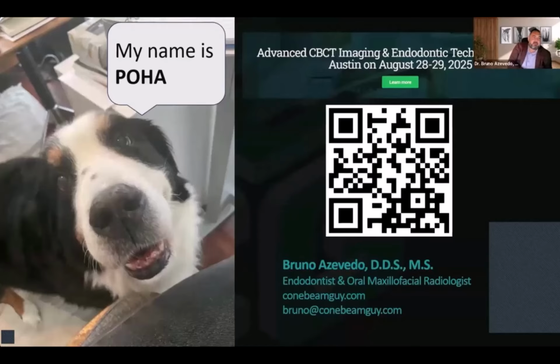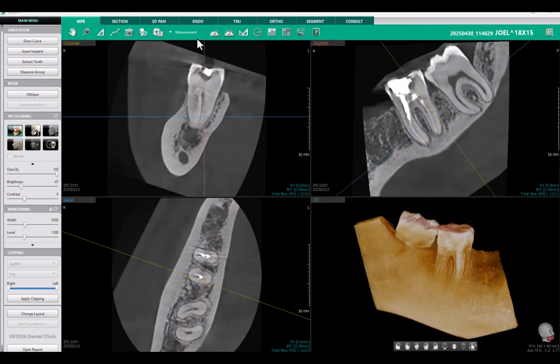way is definitely easier. Alright, so if you've done any amount of root canals, my guess is at some point you've created a much larger access than you probably would have liked. So this video is going to show you how to use the software tools to not only minimize your access holes, but also pinpoint where you should actually begin your access.